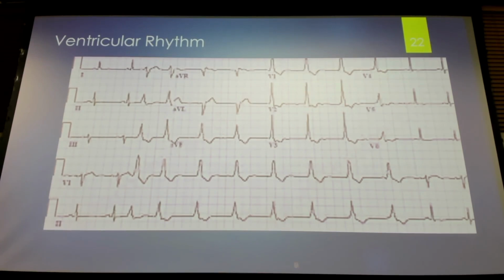Okay, so again, this is a ventricular escape rhythm because we have P, we have our QRS. We don't have much of a T, but we do have a P, QRS, and then something happens. You got an abnormal beat here, and then we go into our escape rhythm here. Okay, and again, this is wide. We go up here, our Q, R, and we come down here, and our T comes back. This is kind of our T here. We come up here, so this is a little bit wide, maybe about 3 boxes wide, and then our rate as well. So this is an escape rhythm.